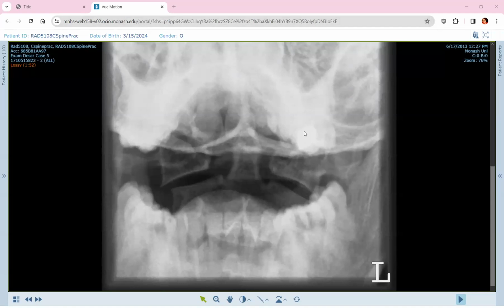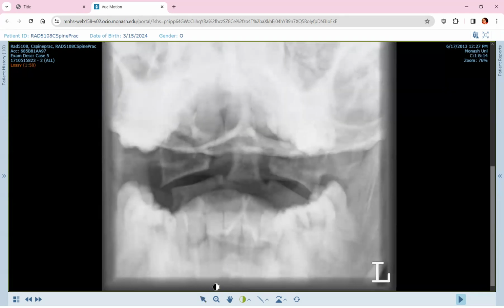The next patient is also a patient who's been in a car accident where the head was forced against the windscreen and now has cervical tenderness. So if we look at the AP view and we look at alignment, it's difficult to see on the left side, but it appears as if the lateral masses seem okay.